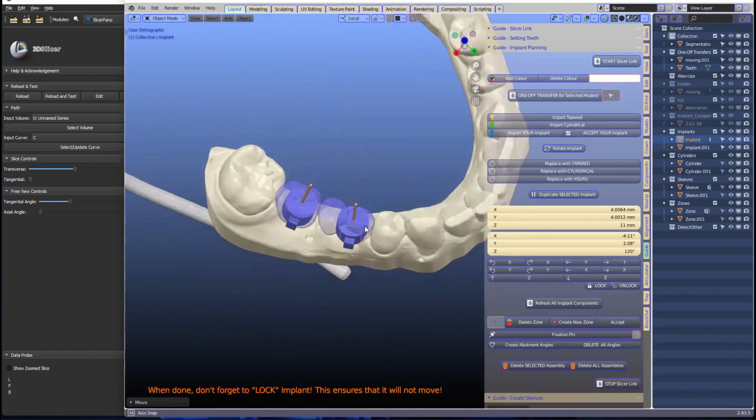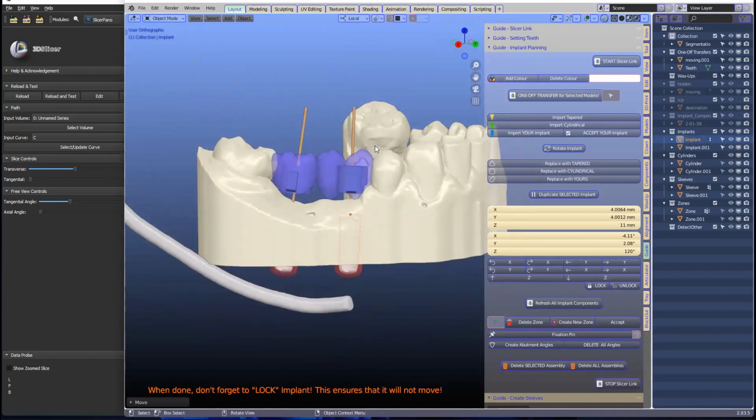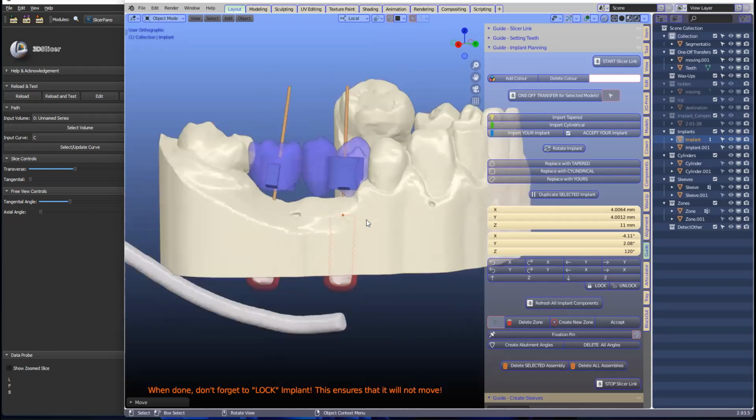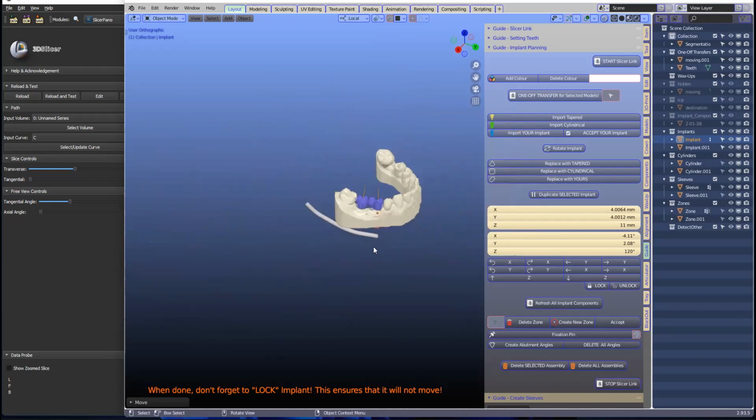Just a little bit of question. When you import the implant from the component module, it was quite hard to move them to the destination model itself. Can we imagine that you just put them, for example, where the cursor is? It will be easier for us to just click on the cursor. You've got a good point there, Baptiste, and that is possible.